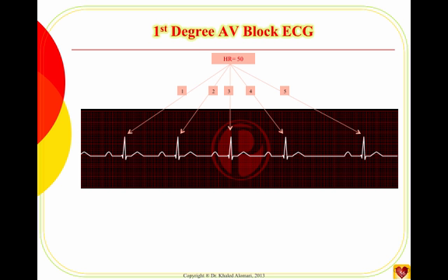The second thing is, look, it's regular. Well, it is almost regular. It is almost regular, but this still continues. They continue to be the first degree.